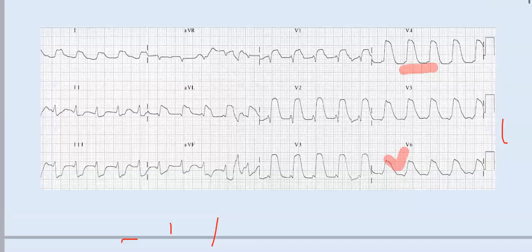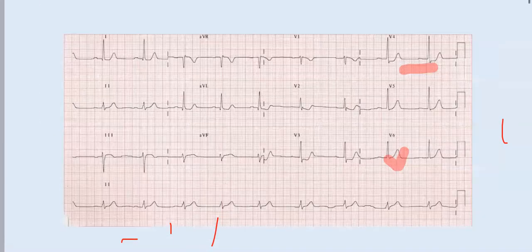Now, what do we have here? It looks like sine waves, but this is not sine wave. This is ST segment elevation of the tombstoning pattern we have talked about and how serious and prognostic that is. And this is extensive anterior tombstoning pattern of ST segment elevation. Okay.